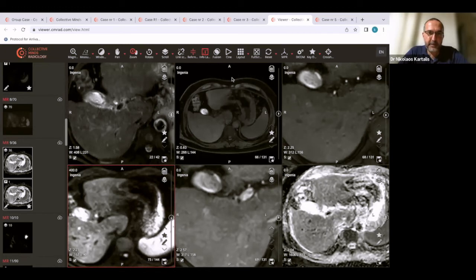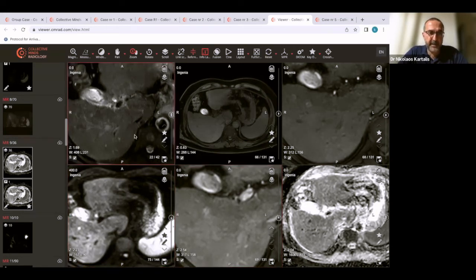We have 33 say hemangioma, 7% say metastasis, 7% intrahepatic cholangio, HCC 53%. This is the majority of the cases. Excellent. Very nice. Let's go to the imaging findings and let me explain what we are seeing here.